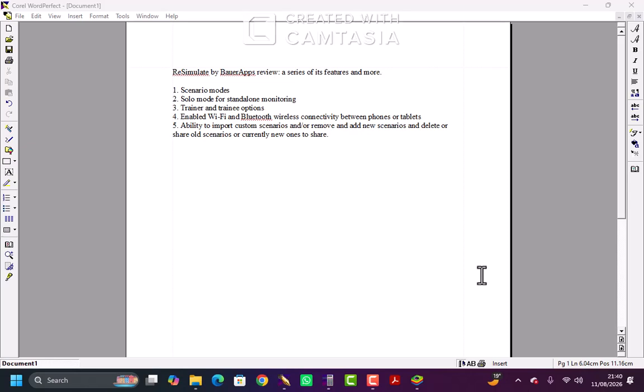In this video I'll be showing you ReSimulate, which is developed and made by BauerApps. Now, the application is developed for Android phones, but not for iOS phones.